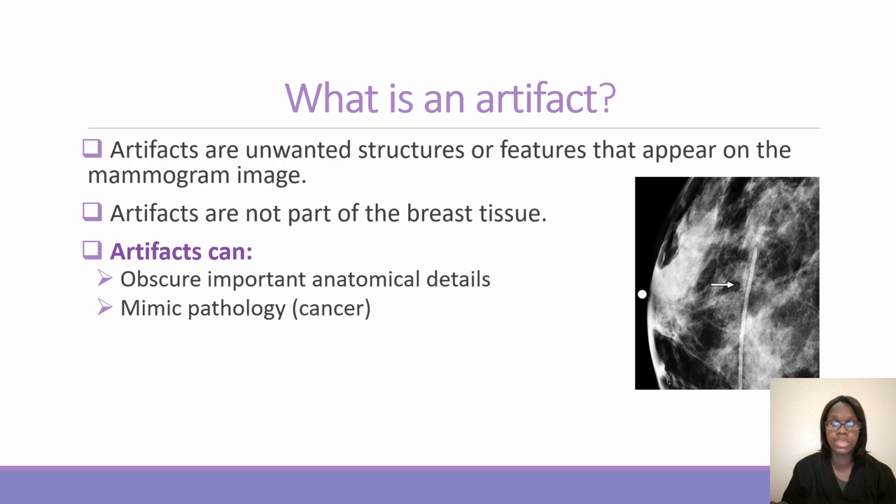That's why it's important to review the mammogram images as you are taking them. Just scroll through the 2D, 3D images before the patient leaves, especially since some patients drive far, maybe they have to work, or maybe it took a long time for them to get in for this appointment. So it's always good to just check the mammogram image. And sometimes I find this helpful.